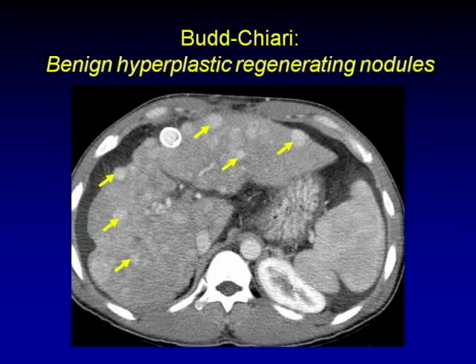And that's the thing, when you get some brownie points, you say, well, it's a hypervascular lesion, you've got cirrhosis, you're thinking of hepatoma. But if this was due to Budd-Chiari, then it could be regenerative nodules, and you can follow them up, look for stability. Some people do biopsies in this situation, but those patients should not be written off.